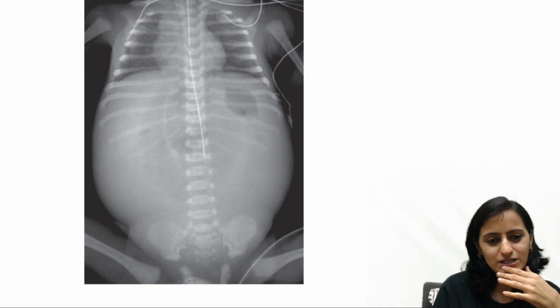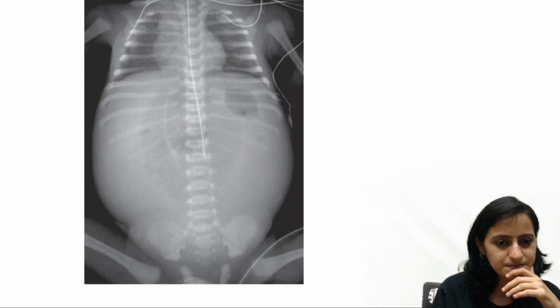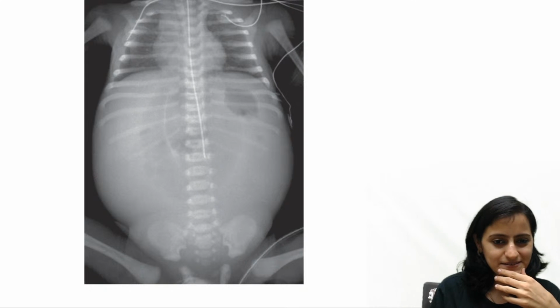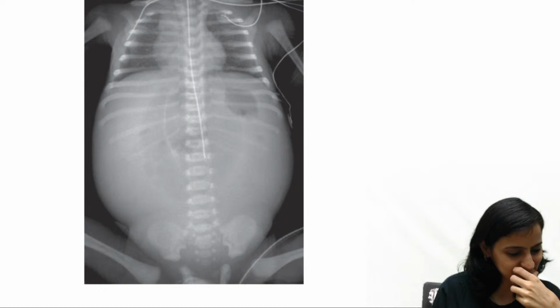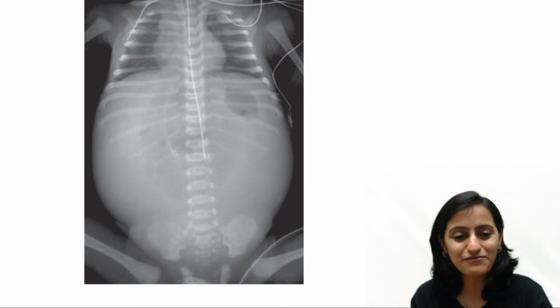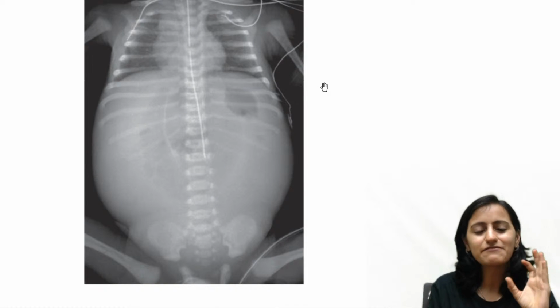No, this is not transient tachypnea of newborn. This is acute decompensation. No, not single bubble, not CHPS, not figure of 8. Okay, let me give you the clue here. So when you are not able to identify, I'll give you the clue.